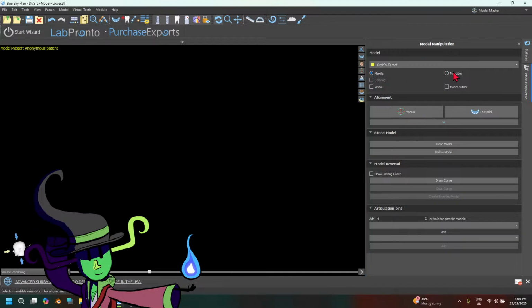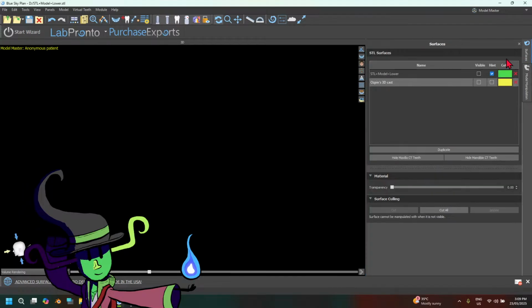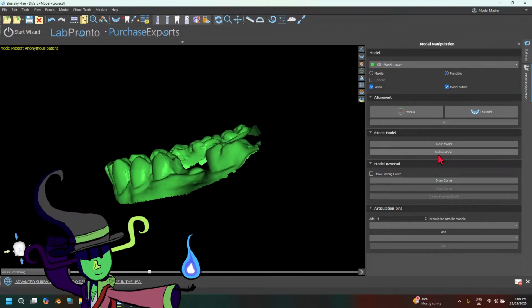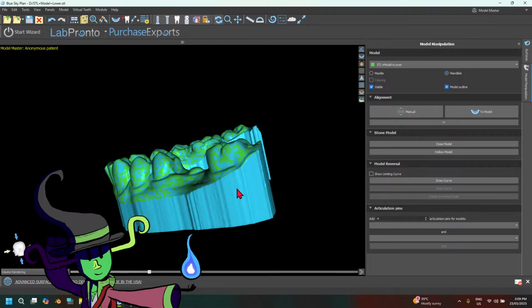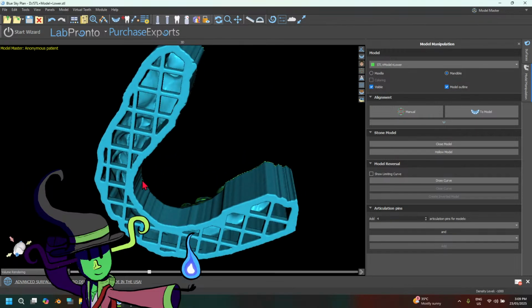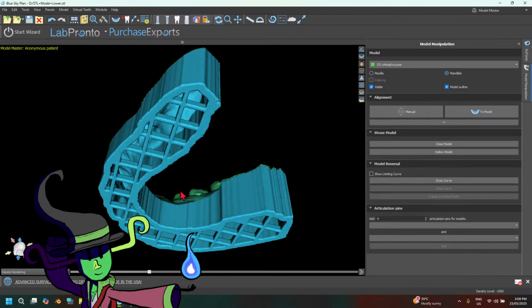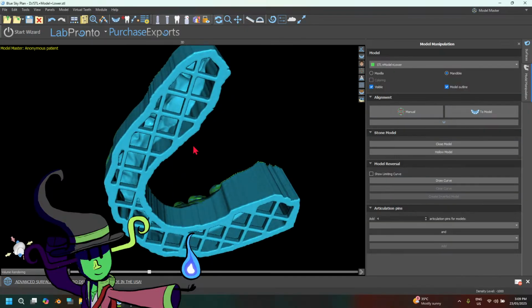Okay, let's go to max. No, so my mandible. I'm going to get this. Thank you. Hollow model. There we go. Come on. Give me the fabricated hollow model. Nice, and just like that, we can create our hollowed out model.